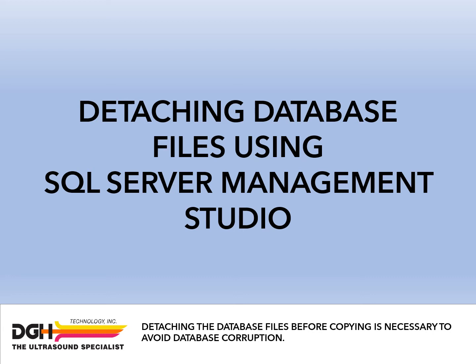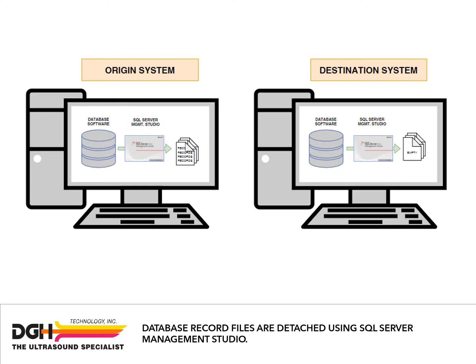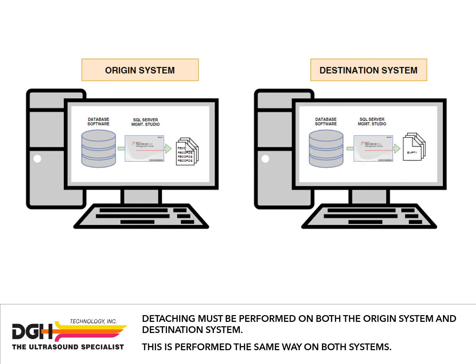Detaching the database files before copying is necessary to avoid database corruption. Database record files are detached using SQL Server Management Studio. Detaching must be performed on both the origin system and destination system. This is performed the same way on both systems.